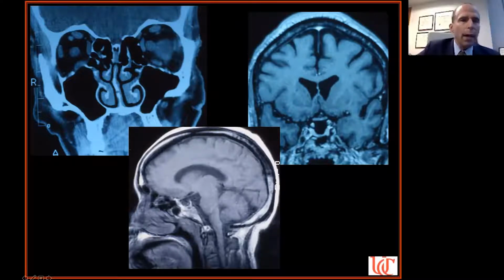normal. And here's a nice sagittal image through the midline with the cerebellum, the pons here, medulla, midbrain. Here's the sella, partially empty. The pituitary gland is being squished down here. Here's the optic nerve and chiasm right here. This structure right up here is the superior ophthalmic vein. We'll be looking again at that in a little bit.